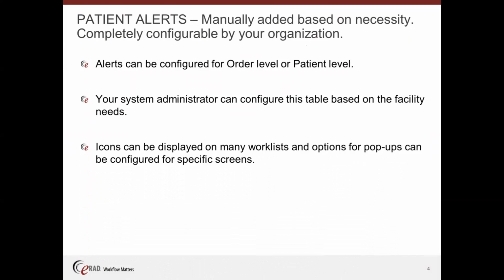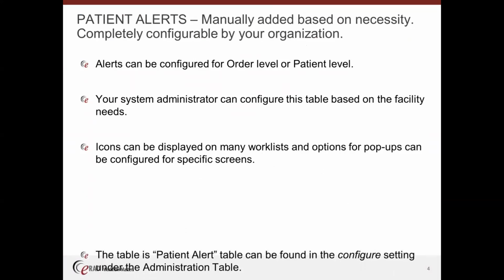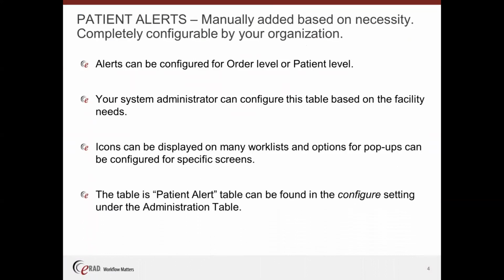So you will have to rearrange your work list to be able to see that column and bring it up front for people to be able to see it easily rather than having to go hunt for it. Where you configure this is the patient alert table in the configure settings and the administration table.